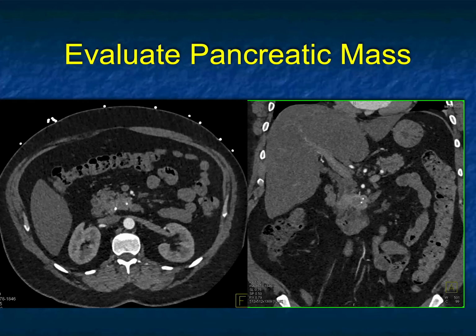My rule is, if you see dense pancreas, even if it's not hypervascular, and usually it is hypervascular, think this is a neuroendocrine tumor. It's atypical. You got to think about adenocarcinoma, but how often do you see adeno with calcifications, unless maybe it arose in a patient with chronic pancreatitis, which does happen, but this is only 2 dots. So this was a neuroendocrine tumor in the head of the pancreas. What a great case.